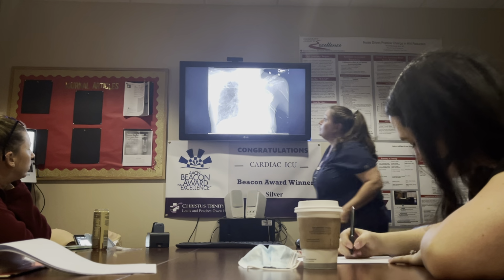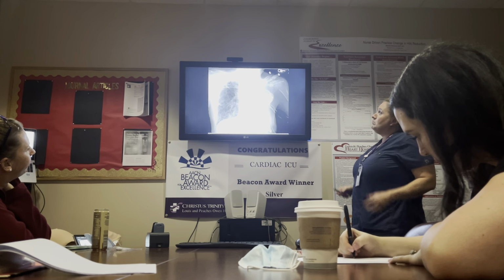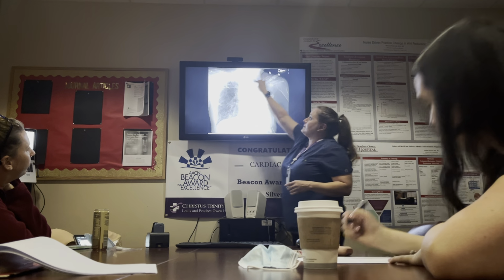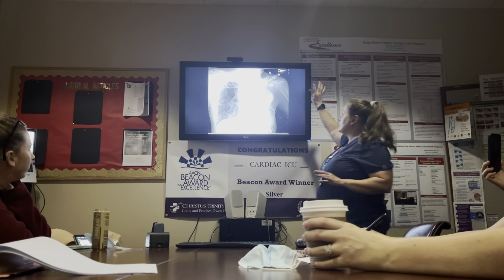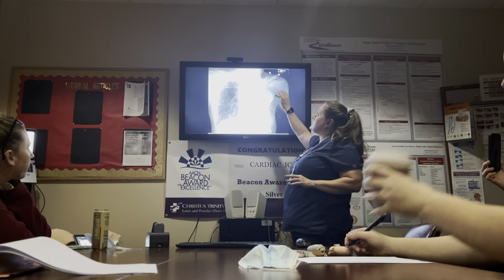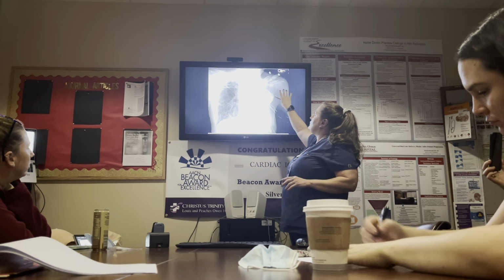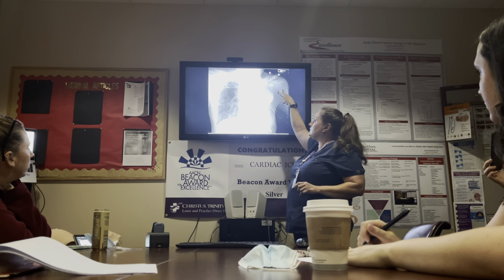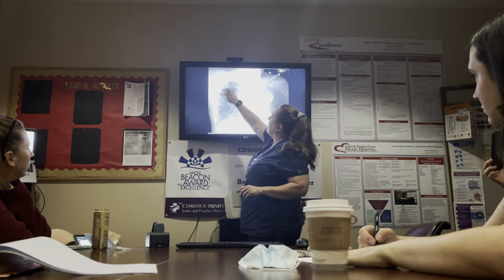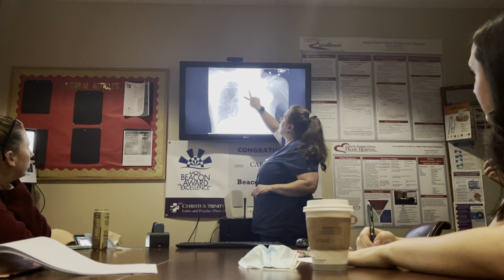Okay, so you guys might very well see somebody like this. Okay, all right, so busy chest. Again, snaps on the outside of the patient. Those are not bullets. I do have some that have true bullets in there, because I've taken care of those patients. But looking at the film, it's a relatively good film. You see that it's a little bit of lucency here, so probably a little bit of osteoporosis. Everything lines up here. You've got a little bit of apical capping. There's something up here that isn't on both sides.